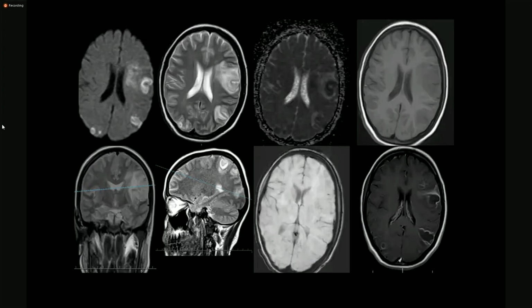मैडम, T1 पे आइसो, T2 ब्राइट और FLAIR के ऊपर hyperintense areas seen in left parietal and bilateral occipital areas, and on post contrast this shows peripheral ring enhancement and multifocal lesions हैं.